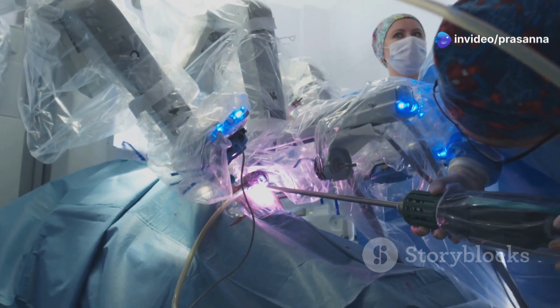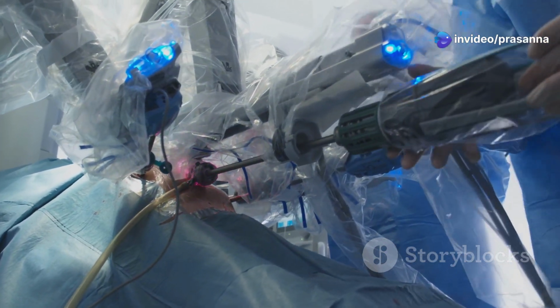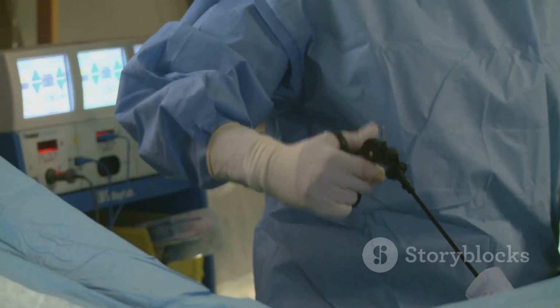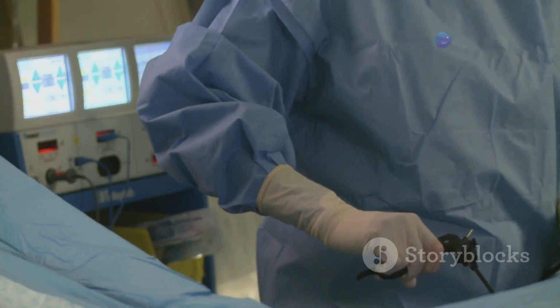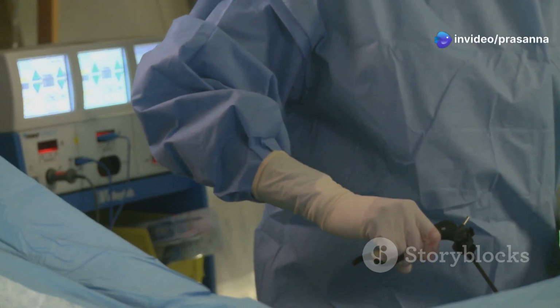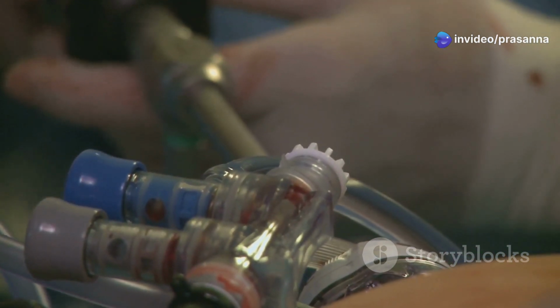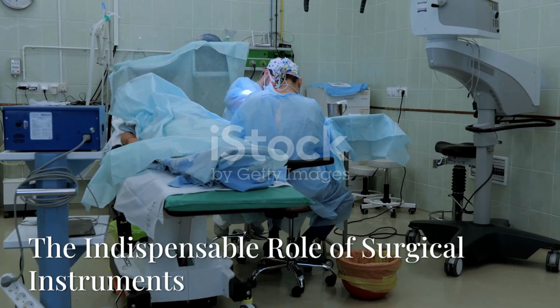Another example is robotic surgery, where surgeons control robotic arms equipped with instruments from a console. Robotic surgical instruments offer enhanced dexterity and precision, enabling surgeons to perform complex procedures with minimal invasiveness. Imagine them as extensions of the surgeon's hands, controlled remotely with incredible accuracy and control.